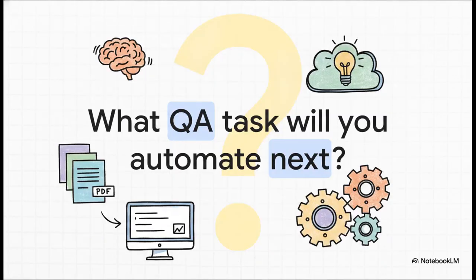So with less than 10 lines of code standing between you and fully automated PDF reports, I want to leave you with one final thought to chew on as we wrap up this explainer on the Medical Physics Coding and Learning Hub. What routine QA task are you going to automate next? The possibilities here are seriously endless.